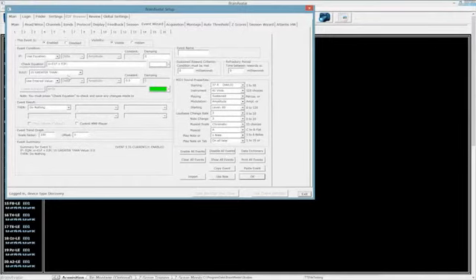All right, so here's where the 3rd event comes into effect that I didn't cover. When I was going through and controlling the sounds, I basically said, and I actually have an error right here, I've got to fix my errors, you only have to worry about event 1 and event 2 and 4 controlling the sounds. But I didn't really go over what event 3 does. Well, event 3 is actually a very important thing because right now we're flagging those. So I'm saying if the event condition for event 1 is true, and then add that to the event condition of event 3 being true, I want them greater than 1.5.